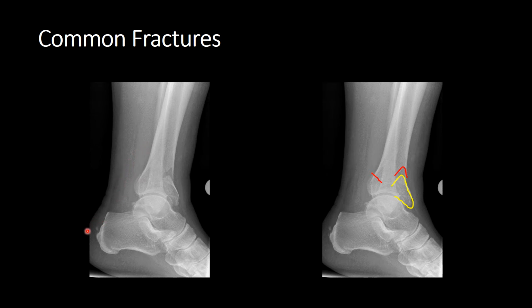Now don't get confused, you might see this little tiny osseous body adjacent to the posterior calcaneum. This is where your Achilles tendon inserts, and you can get what's known as enthesopathy. Enthesopathy is degenerative change to tendons and ligaments, and what's happened is they've just got a little bit of calcification within the tendon there. So this shouldn't be misconstrued as a significant traumatic part of the trauma complex. You can tell that because it's nice and round, and also because of the location there.